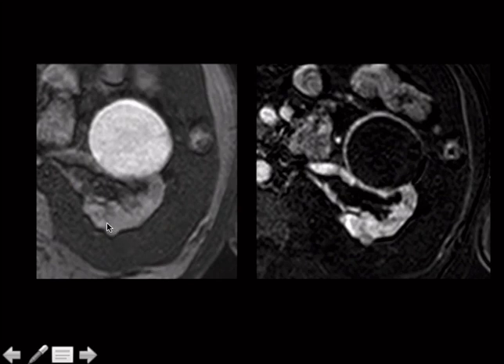Now, what about this guy down here? That's also T1 bright, and that appears to be enhancing. So you can see right there that there is some internal brightness. It shouldn't be there. So that's enhancing, so that's a renal cell carcinoma.